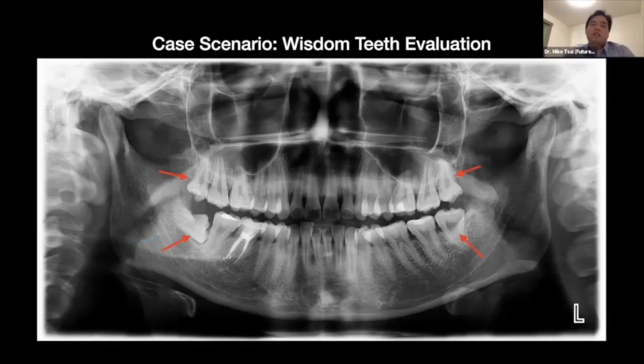So last but not least, I like to look at wisdom teeth last. When I look at these types of X-rays, I look at everything else first. This is called a bias, satisfaction of search. You want to make sure that you don't look at the most obvious thing first; you look at the least obvious things.